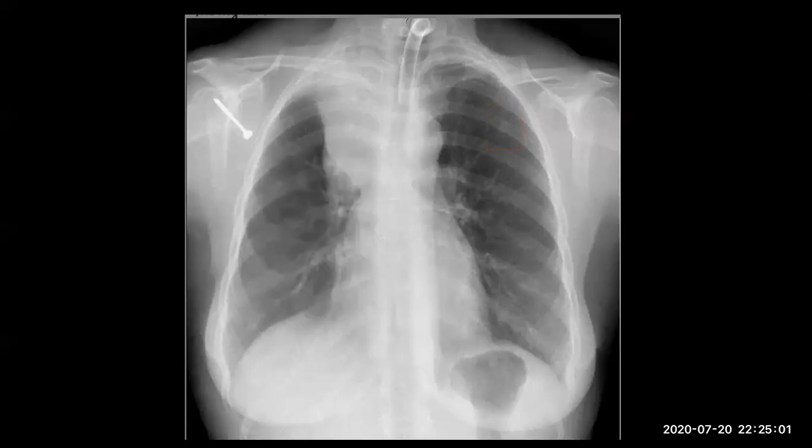Okay. So this is a classic case of Golden S sign with bronchogenic carcinoma with nodule metastasis to the left upper zone. What is the stage here in this patient?